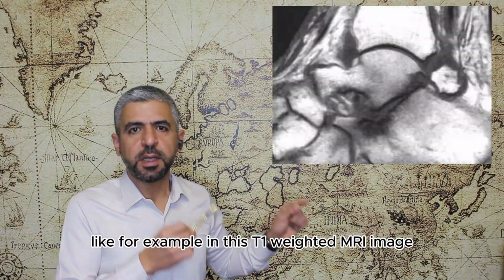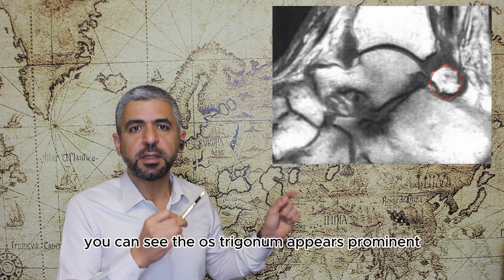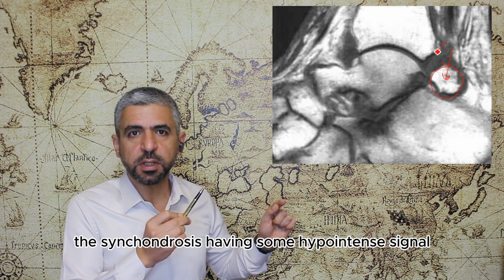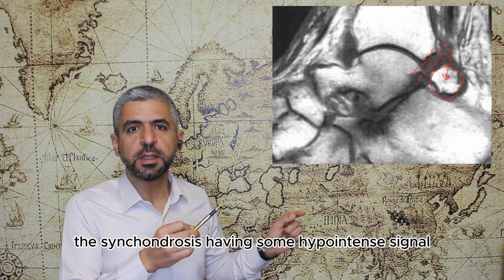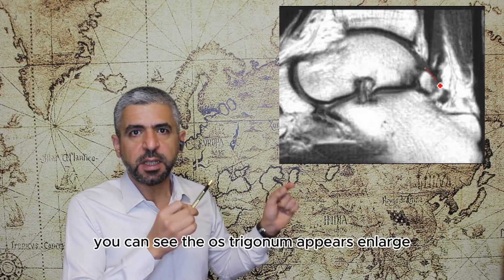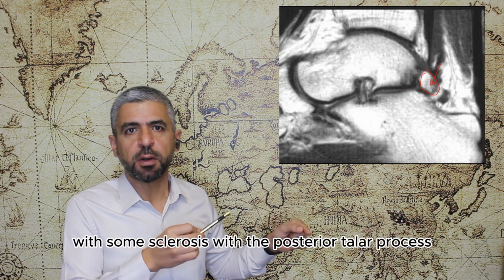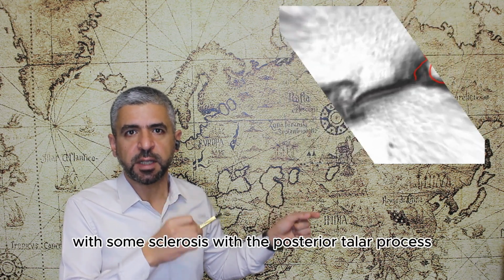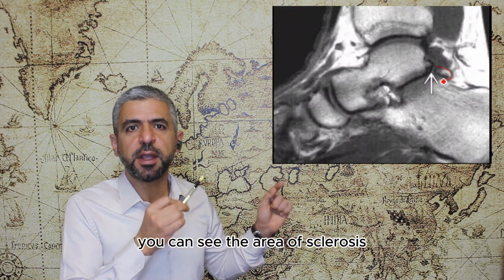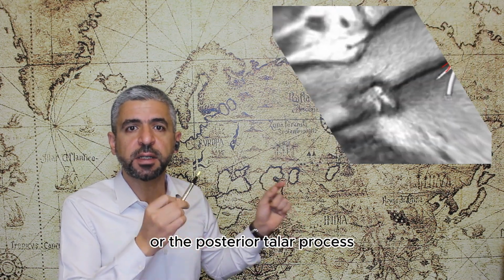For example, in this T1 weighted MRI image, you can see the os trigonum appears prominent, enlarged, with fatty marrow, and you can see the synchondrosis having some hypointense signal, which might be due to sclerosis or edema. Another example, you can see the os trigonum appears enlarged, well-defined, fatty marrow with some sclerosis with the posterior talar process. Again, another example, T1 weighted image, you can see the area of sclerosis at the posterior aspect of the talus or the posterior talar process.